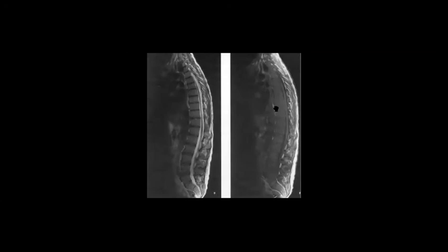So, for example, if this patient has stress or smoking, or any medication, sometimes he has something called red marrow conversion, but it will still be more than the skeletal muscle and the disc space. So you can differentiate between both. Also severe anemia. Perfect.